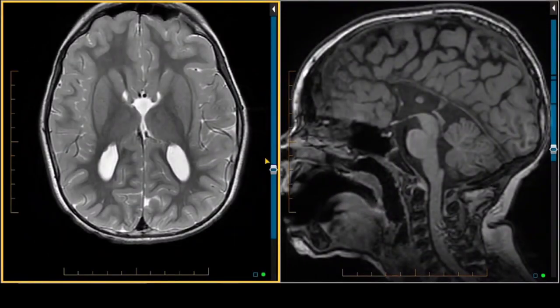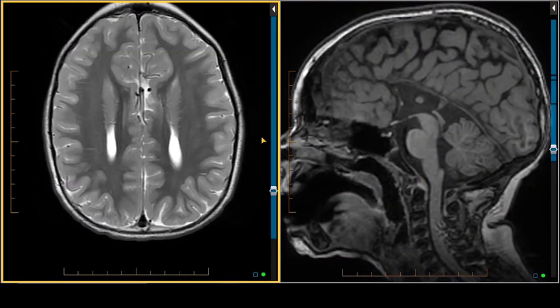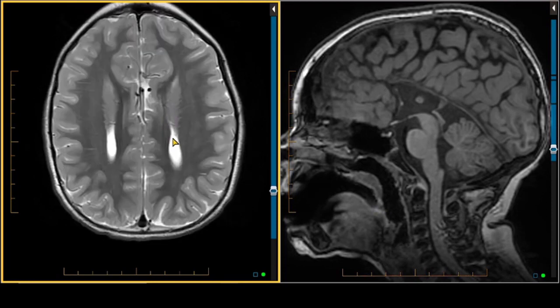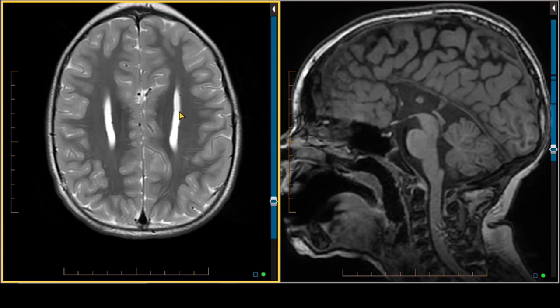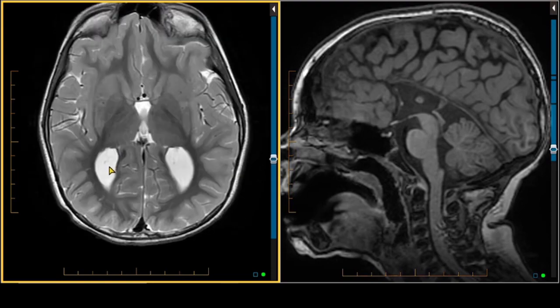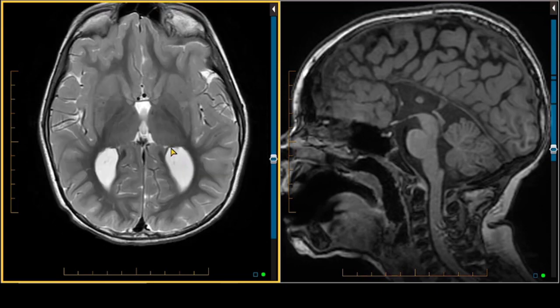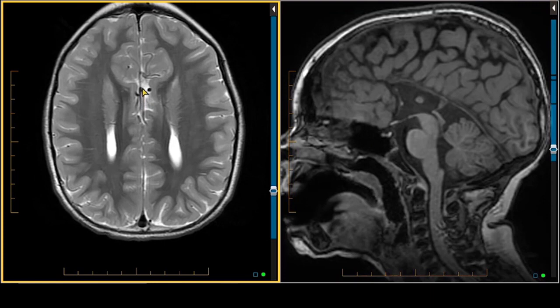This is an MRI scan of the brain in a 5-year-old child with developmental delay. One of the first things we see is there's an abnormal configuration of the lateral ventricles. The bodies of the lateral ventricles are somewhat parallel, whereas normally they sort of angle laterally as you go posteriorly. As we go inferiorly, the atria and occipital horns of both lateral ventricles are larger than we typically see. This is called colpocephaly. As we go up, we're seeing no intervening corpus callosum.